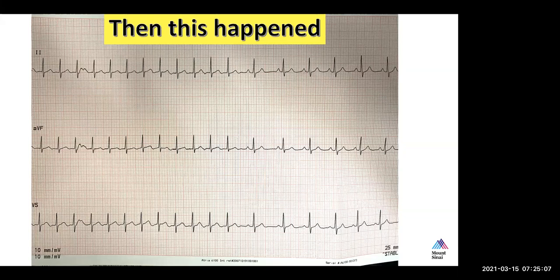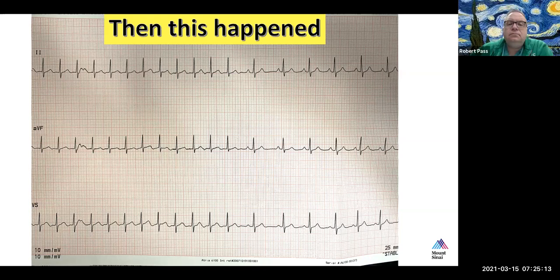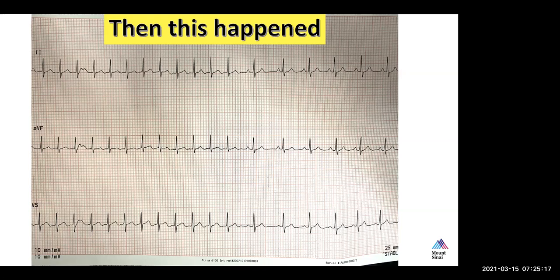And the QRS complexes in the sinus beats, as well as the tachycardia beats, could say are quite similar.